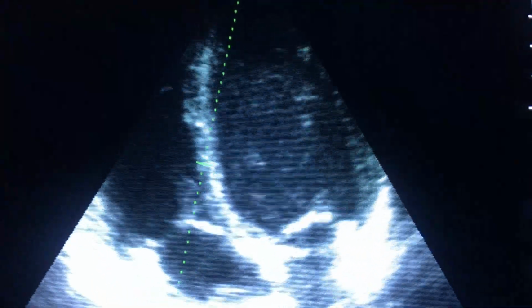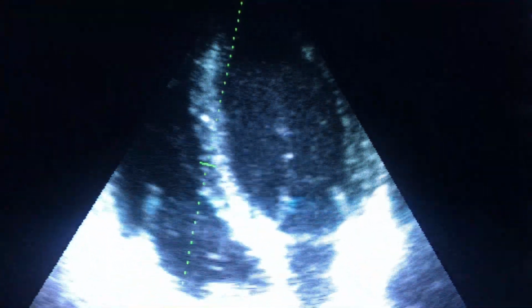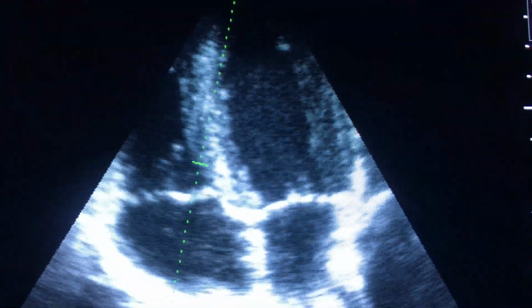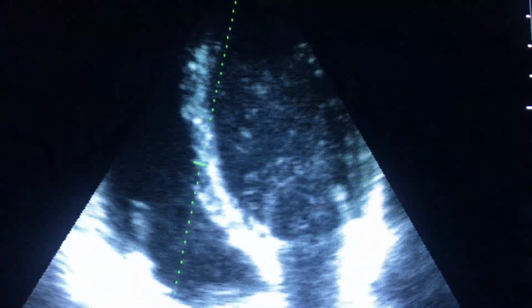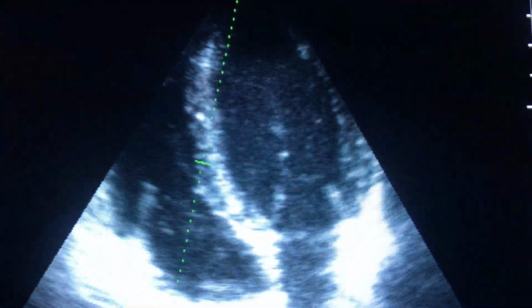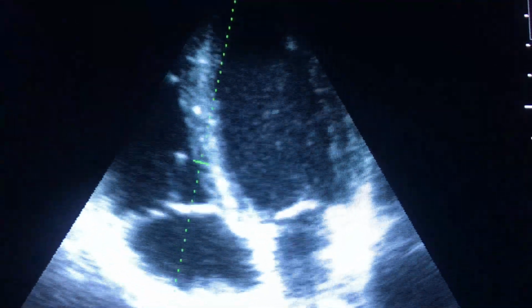To sum up, there are three types of contrast in echocardiography. Contrast media we inject in the heart, and a spontaneous echo contrast, which includes a smoky contrast which has the hazard of thrombus formation, and a normal non-smoky spontaneous echo contrast.